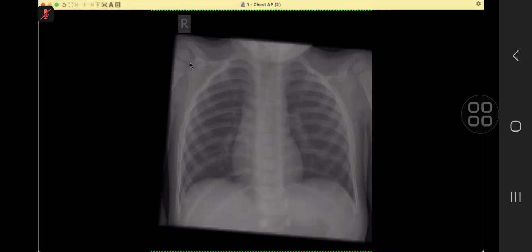And one can argue that there might be a slightly hypoplastic glenoid, so that finding was fine. If you see the ribs, they are slightly more oblique than they normally are, but this is a very subjective finding. And as far as this pelvis is concerned, again, this thing is hanging.